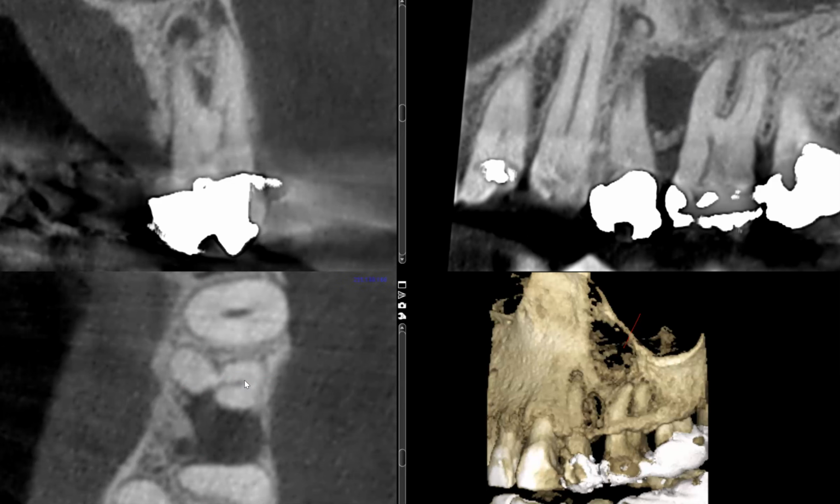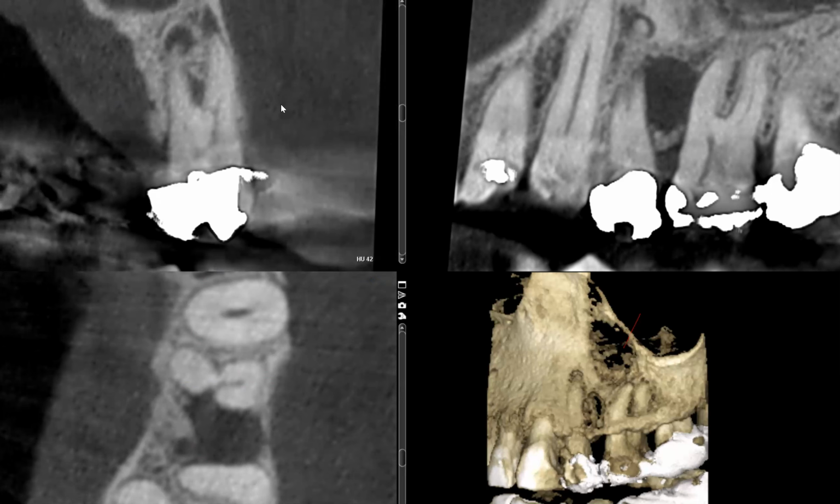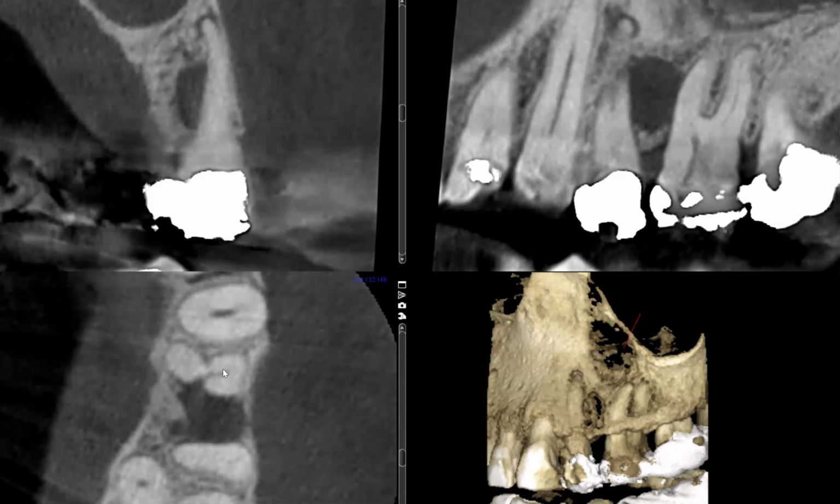So you can see how important or how valuable this CBCT scan can be for endodontic evaluations. We were able to save the patient from perhaps unnecessary biopsy, not only the cost, but also pain as well, right? Okay, anyway, that's the point that I wanted to make with this video.